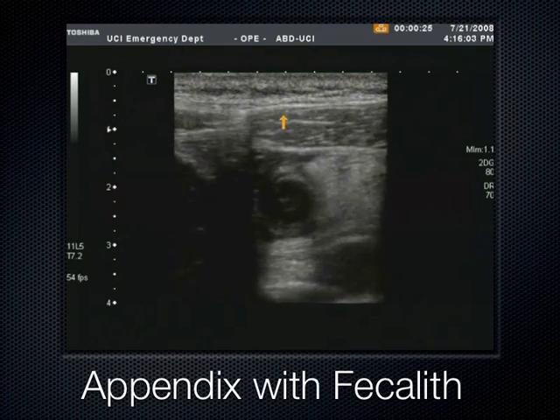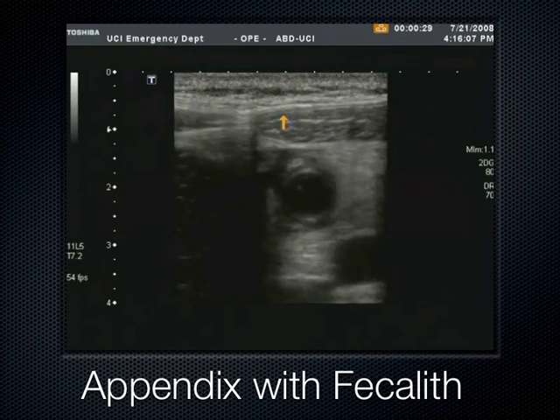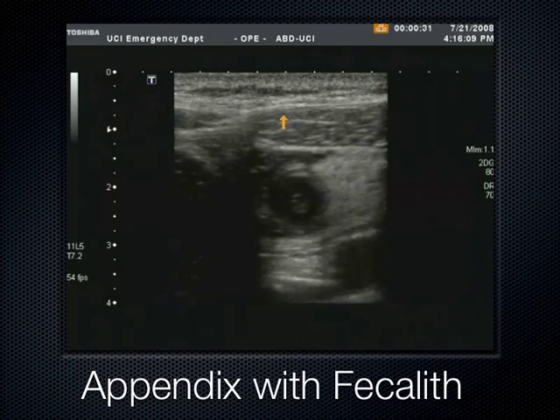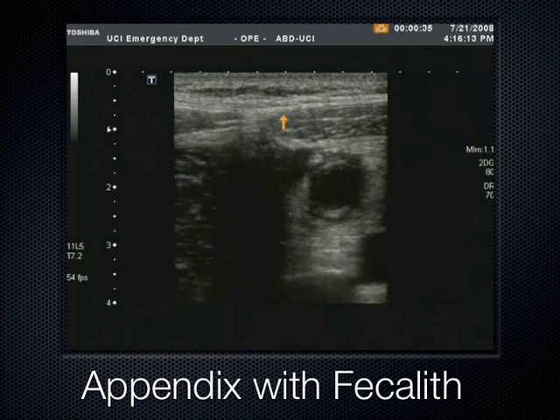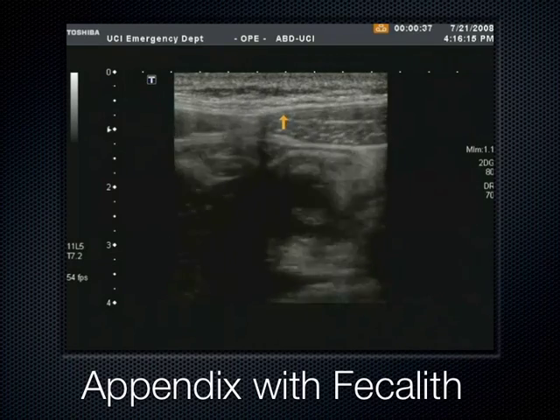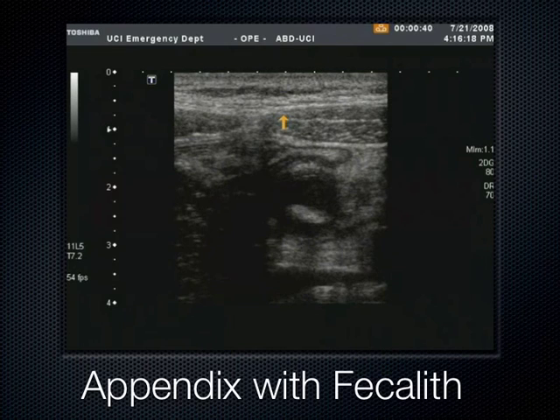Here is one last example of another patient with appendicitis. We can see here, this is the abdominal wall musculature. Again, this theme keeps coming up over and over again. Here's psoas, somewhere down here, smushing this appendix between the two muscle structures. I think psoas is actually over here too. I see it over here. And this one's got a little fecalith right there. You see that? Which literally means poop stone right there. That's inside the appendix.